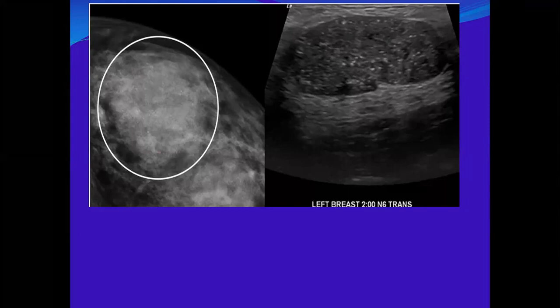Okay. So based on this spot mammography, before going for ultrasound, you are going to report it as BIRADS what? BIRADS 5. I will put it as 5. Why 5?